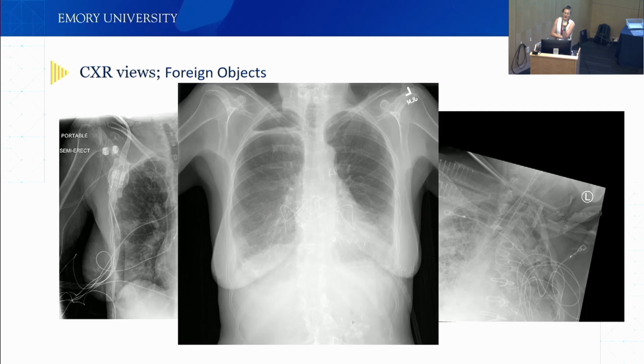I mean, to be very honest, I don't think this is necessarily obese. This is just a woman. But this patient, for our intents and purposes, is actually not that obese. Like, there's not that much fat here.